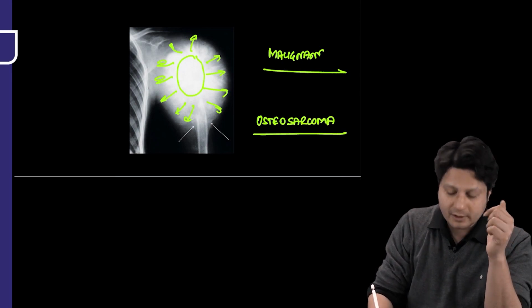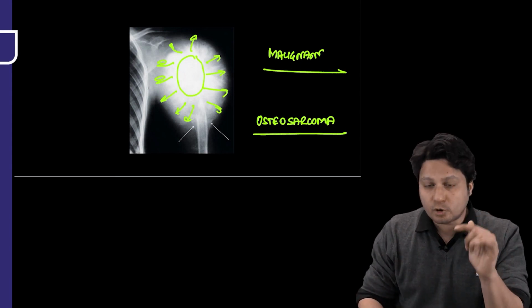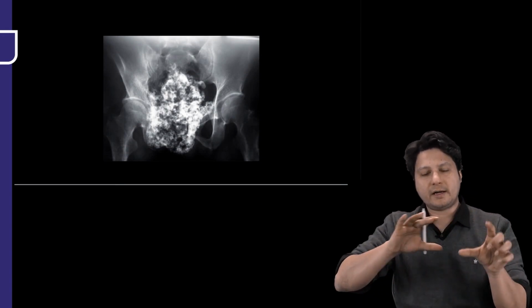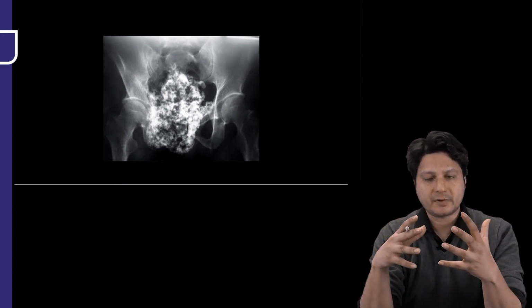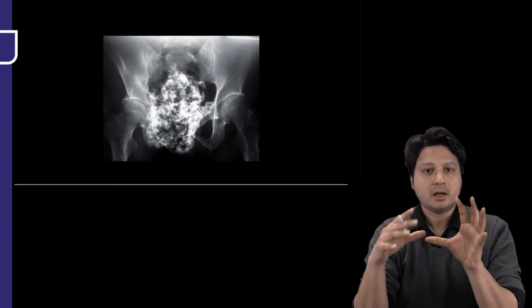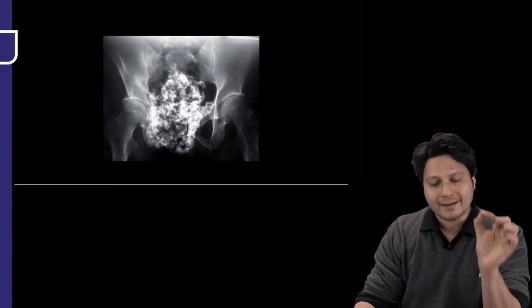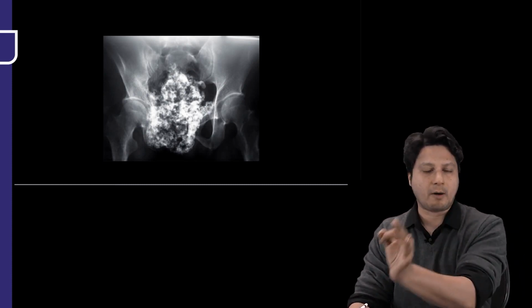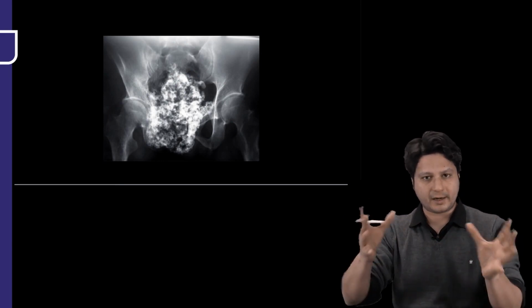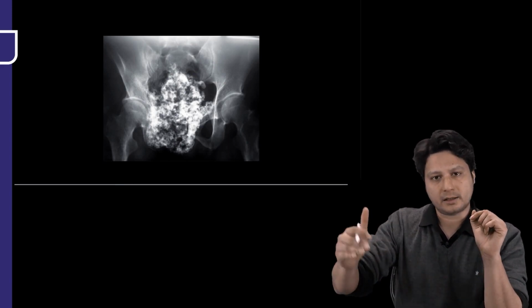All right. In the upper limb, the proximal humerus is the most common site to be affected by osteosarcomatous tumor. Now, one of the X-ray findings that you have written is speckled, that means an inhomogeneous kind of C-shaped, comma-shaped or popcorn kind of calcification which is disorganized or ill-organized. So it is representing a cartilaginous tumor, and in a case where the tumor is spreading beyond its confines, that means it is a malignant cartilaginous tumor.